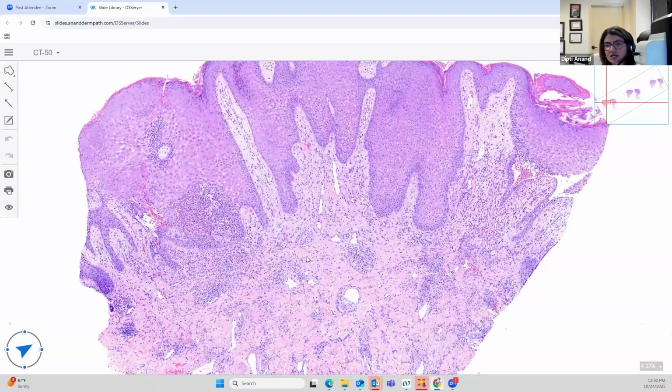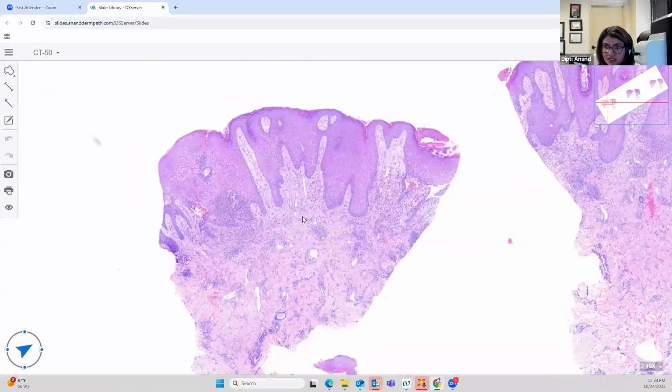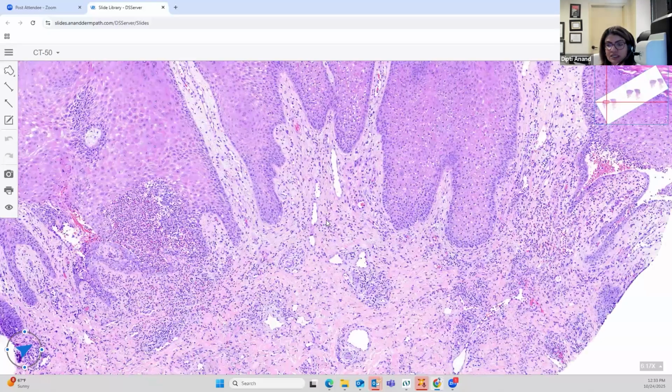Instead, what you see here is the suprabasilar acantholysis. You can see the nice tombstoning happening in here, which will be very subtle. Okay, so this is pemphigus vegetans. And the other thing which can be present, which is not in this slide, is plasma cells. You can often see dermal plasma cells, because the vegetative plaques more commonly arise in the axilla or the intertriginous sites where plasma cells are present.